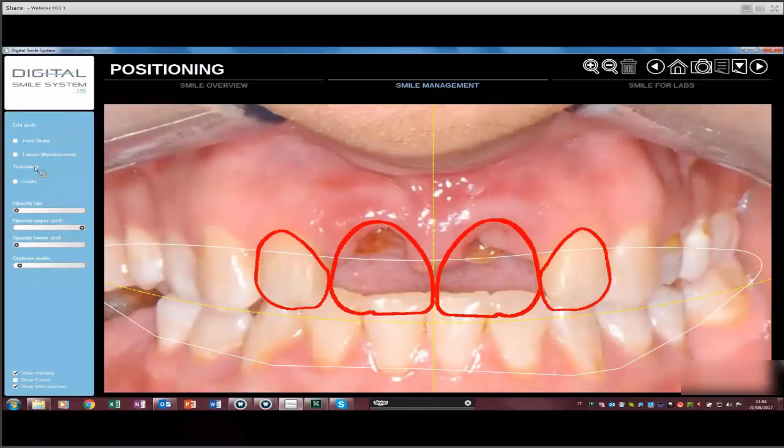I can see that in the original situation, the lateral has this shape, but I want to modify it and extend the height of it a little bit. Or, I don't know, the inclination, for example, or the shape. It is very, very simple. Okay? And I can do that for every type of tooth.